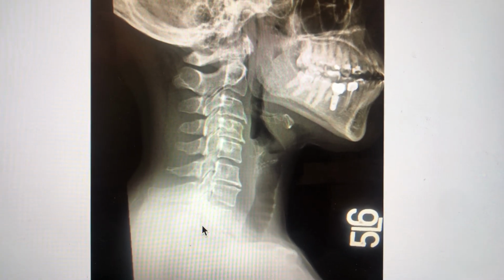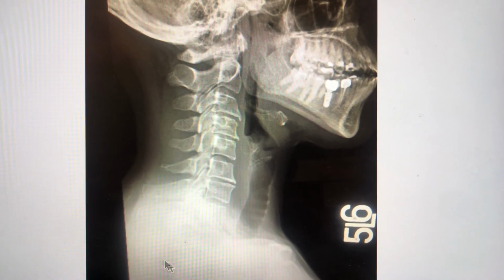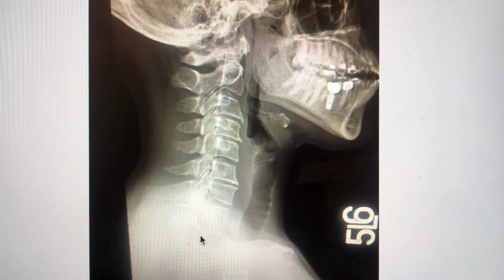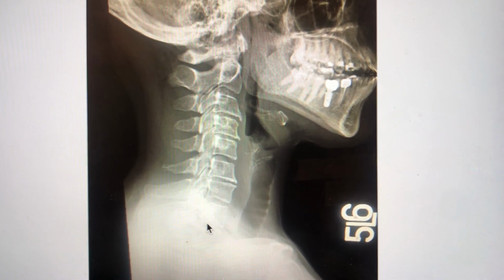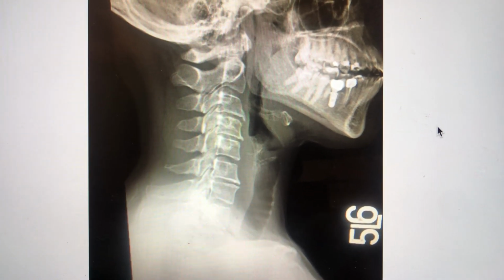Keep in mind, this first thoracic vertebra, if you could see better through all the musculature here, which normally does, and in this case does, obscure the vertebrae in the middle back or thoracic area, you would see a rib articulates with this one.